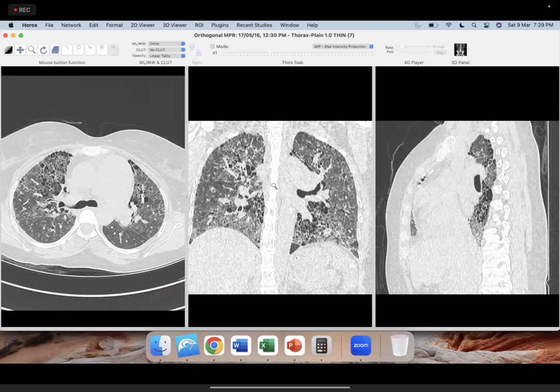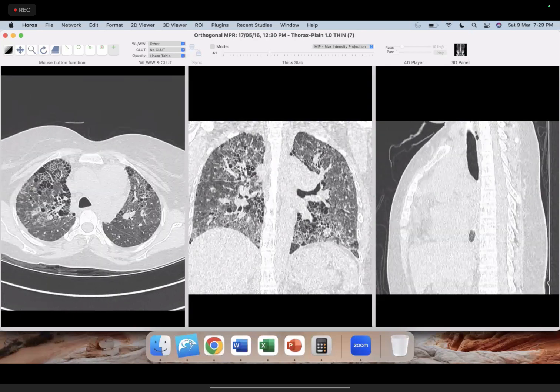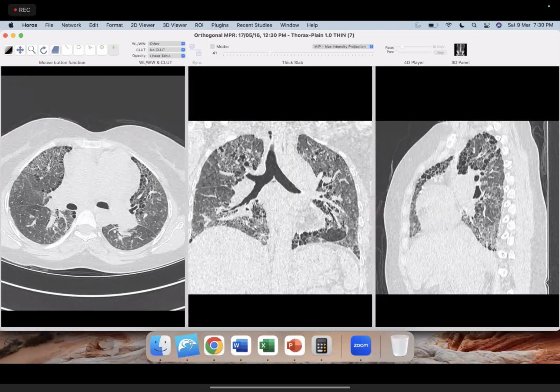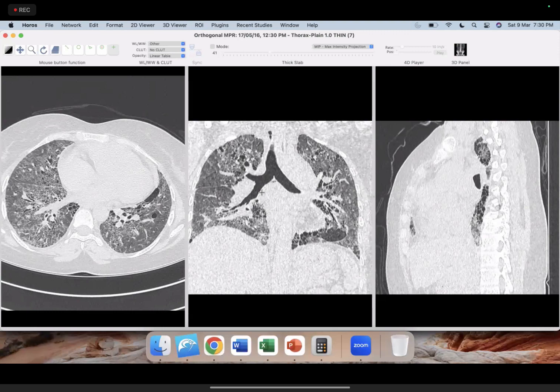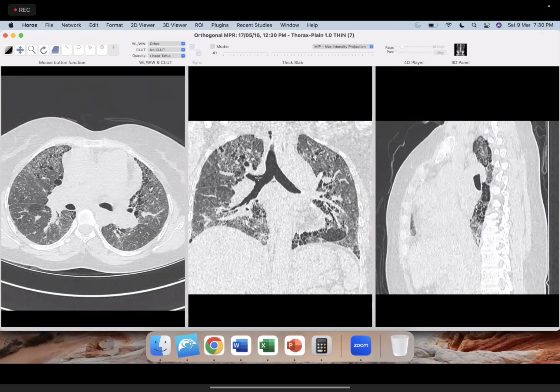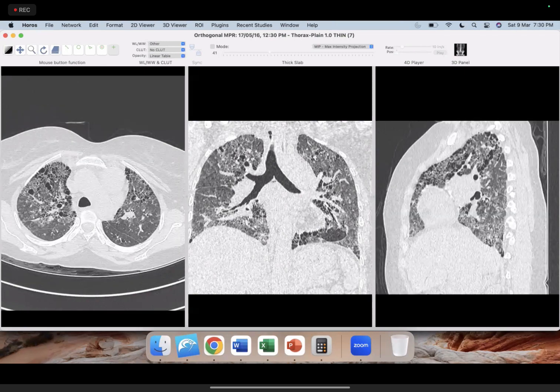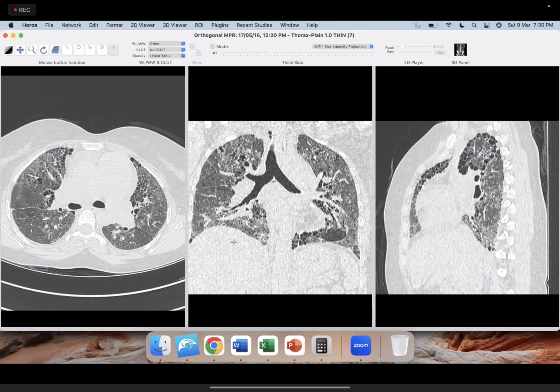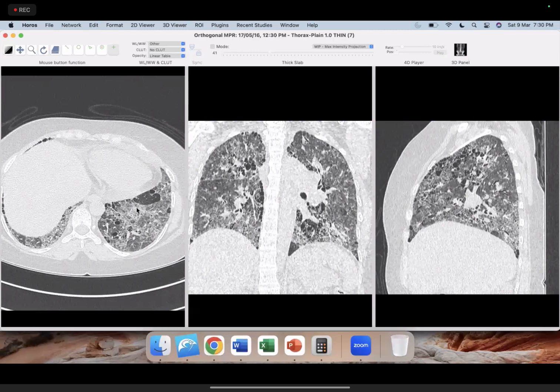So this is rather the final bucket which we just discussed, where we see upper lobe predominant bronchocentric fibrosis, honeycombing, plus ground glass and nodules. This is your non-IPF diagnosis, and typically, like I said, these are cases of chronic HP or sarcoid. Based on this, the nodules, if they are present, will help you. Here we clearly see bronchocentric nodules, with, if you can appreciate, lobular air trapping also. You can do expiratory scans to confirm this. Can you appreciate these lobule-like areas of air trapping? That's your lobular air trapping.